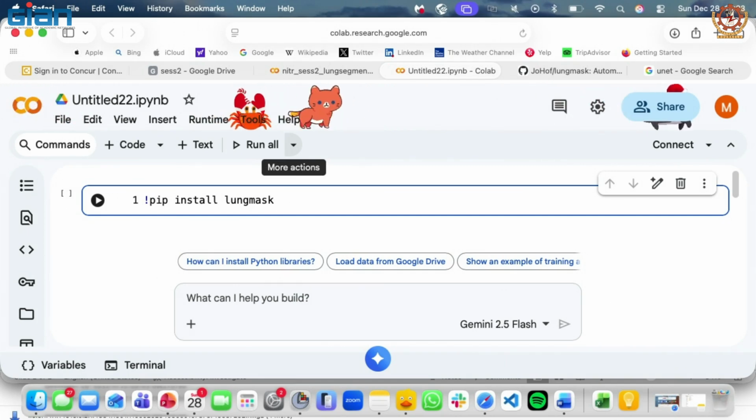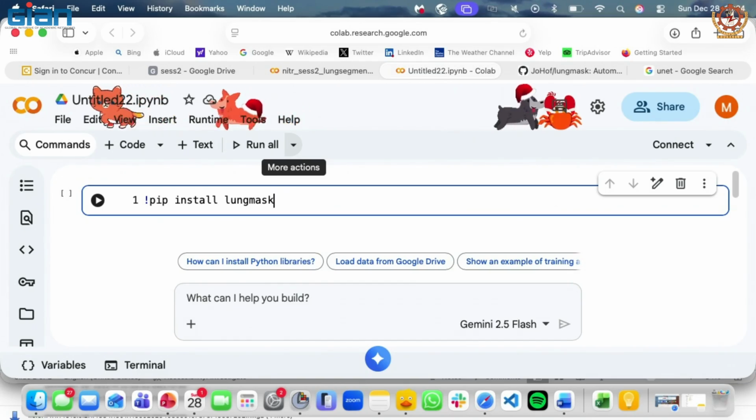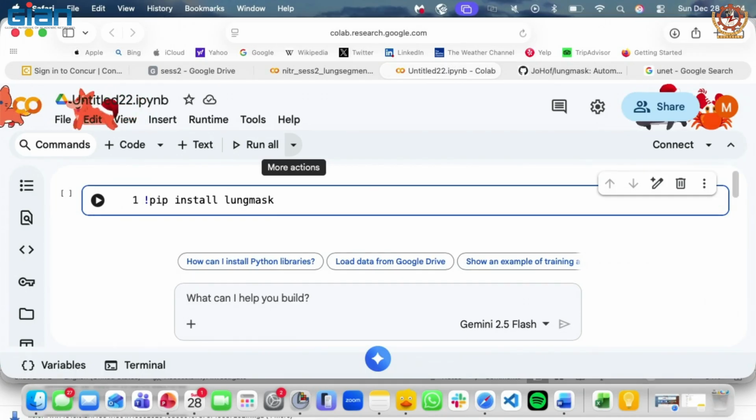Are you guys following, opening the new notebook and everything? Everyone is following, right? We'll just take some time. If you want to run it slower, you can use CPU, but I hope you will not, so change it to GPU.